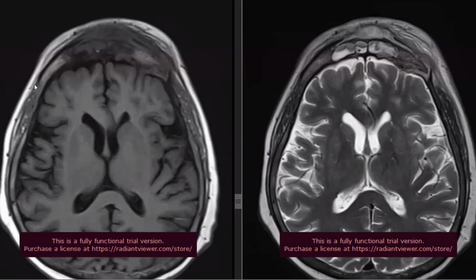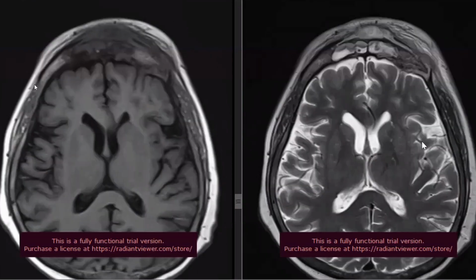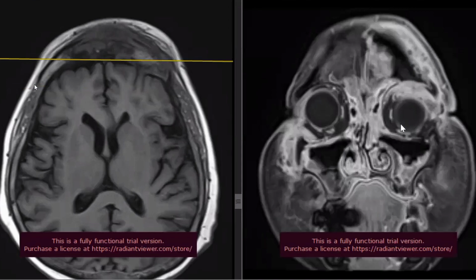So this likely appears to be an abscess formation involving the frontal sinus as well as its overlying subcutaneous soft tissue. So this likely appears to be a Pott's puffy tumor. Okay, so what is the cause here? Basically it is a sinusitis infection which causes erosion of the bone and then extends into the adjacent subcutaneous soft tissue. Sometimes they may also show intracranial extension as well.